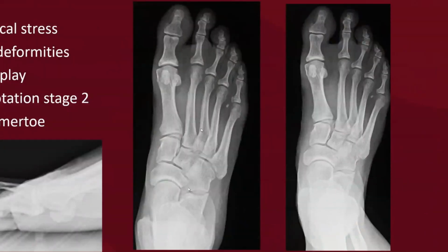So after we've looked for our standard fractures and whether or not we have malalignments, including looking at the base of the second relative to the middle cuneiform to assess our Lisfranc injuries, we can begin to see other changes in bones that may tell us about biomechanical stressors, including what's seen here, which is this cortical thickening seen at the second metatarsal. In addition, notice it's slightly bowed.